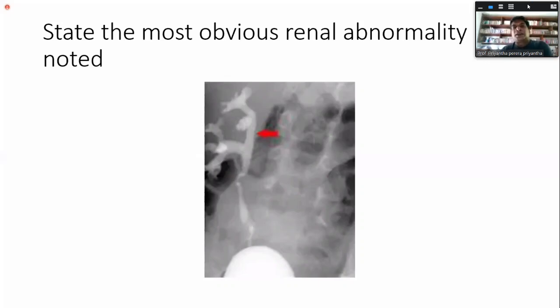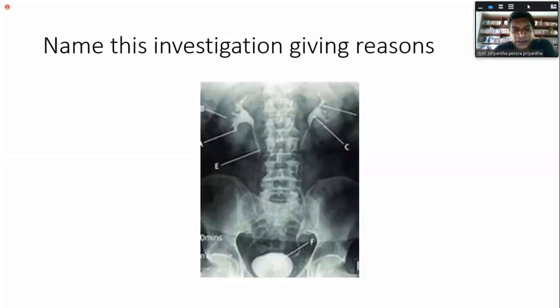But if you suspect a duplex system, you have to go for an IVU. Right? What is this investigation?